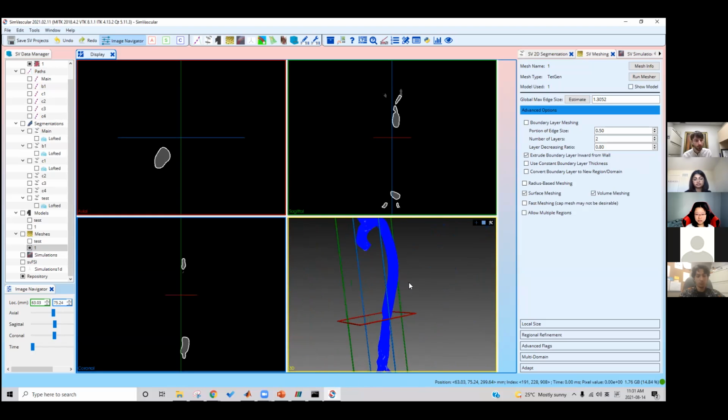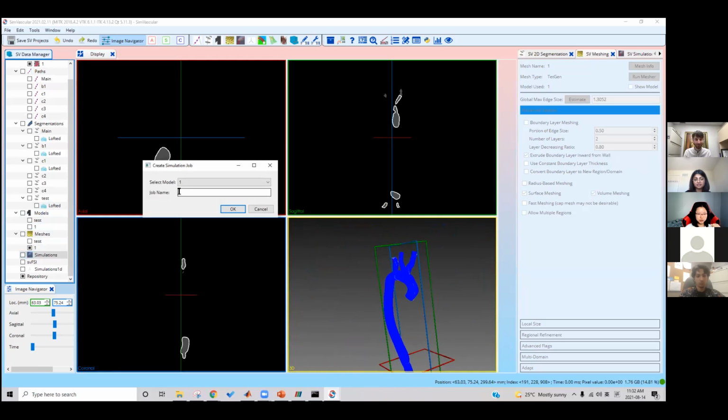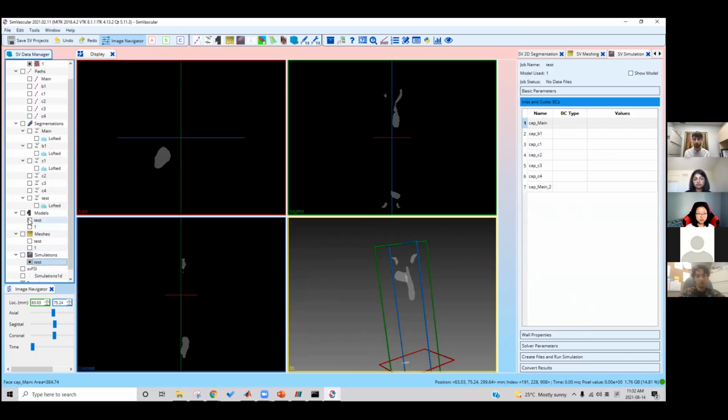And then comes the exciting part after all this modeling, which is the simulation. You usually don't run simulations on your local computer because it's way too much, even for my desktop computer. So here you're going to set a few parameters. I usually leave these parameters alone. This is the one that you usually have to set for yourself. So I'm just going to show the model so it looks a little bit clearer.